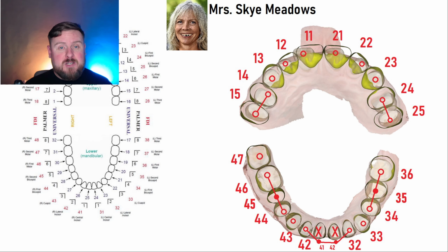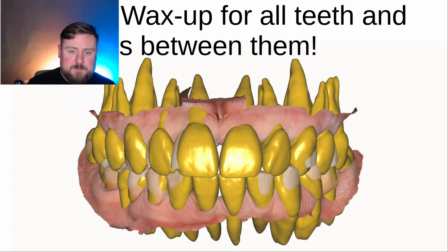All teeth in the patient's mouth have to be waxed up. You make a digital wax-up of all teeth. Restore all lost surfaces. Correct the positions using the crown morphology, adjusting, playing with it. You can design pontics where there are no teeth, the pontics which are hanging in the air and pushing the soft tissue. You can play with the cervical part. You can play with where to position it according to your knowledge and how you think is best.